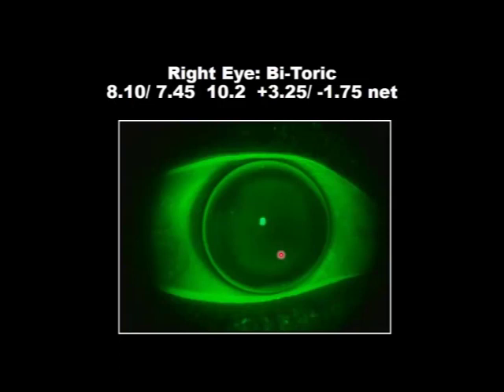So although the topographer may not always give you exactly what you need, it will usually tell you what definitely not to do. But you can consider on the regular corneas that you could custom order right from the topography. On the irregular corneas, we usually have to over-refract anyway, so use the topographer to choose the right first diagnostic lens.